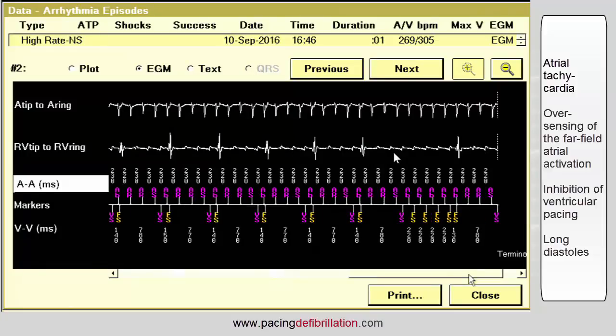The AV conduction in this patient was abnormal. When there was no intrinsic conduction, the oversensing inhibited ventricular pacing, explaining the pauses and the lipothymia. Since there is no QRS here, the level of sensitivity remains very high, explaining the prolonged oversensing until the next intrinsic activation.